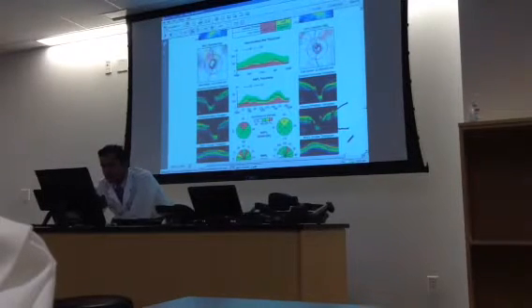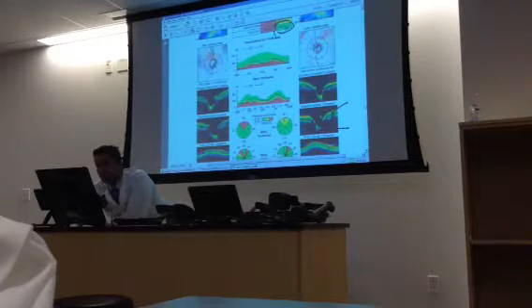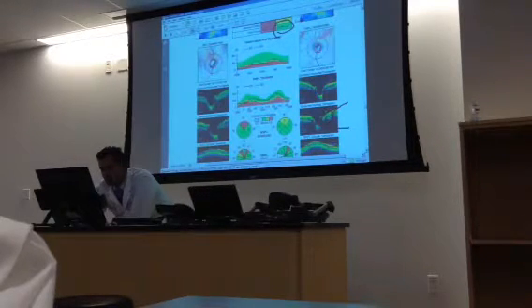And these are imaging artifacts or algorithm failures. And you need to write those down, saying that imaging artifacts visible, algorithm failures, cup volume may not be as indicated by the machine. So for this patient, left eye, the cup volume is actually underestimated on the basis of these errors that are visible right here.